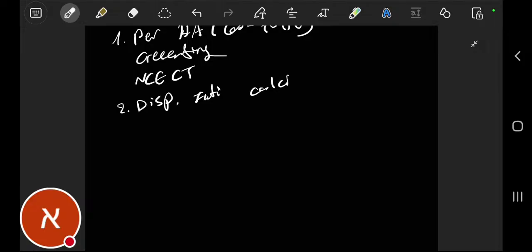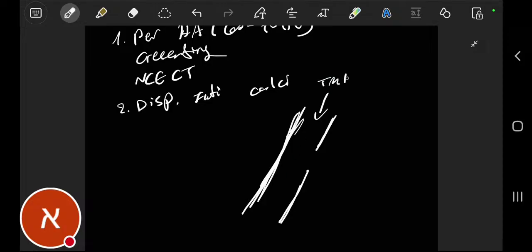What we're talking about in ulcer-like projection is like this. We have the wall of the aorta, and the media where the intramural hematoma lies. This is the area of the intramural hematoma, this is the true lumen, and this is the other wall of the aorta.